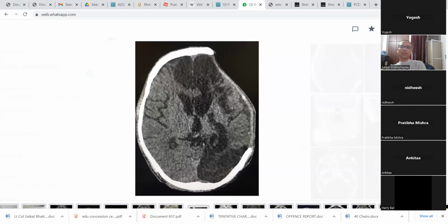The other thing that could have been, although there is a large part missing here, and because the PCA territory is also involved, in some cases you might have a large malignant MCA territory infarct, which might also need to be decompressed, and the appearances might be similar. But this is absolutely good guesswork, meaning calculated, measured interpretation of whatever the findings are. Good.